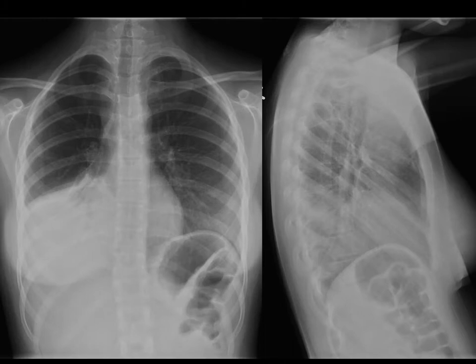So this is a case of a 14-year-old girl sent in to see you from her family doctor. She had a chest x-ray done 3 days ago. She'd been started on azithromycin, and he sees her today, and he gets a repeat x-ray, and he says, you know what, she's not doing any better. Look at that. She needs that tap because clearly she has a pleural effusion now on that right side.